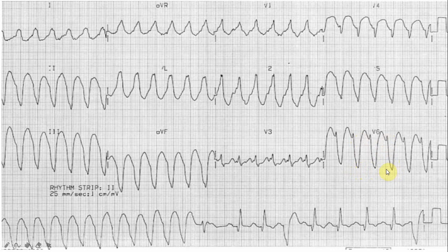In this particular ECG, the distance between the beginning of the R wave and the nadir of the S wave is 4 small squares, which is about 160 milliseconds. Obviously, the Brugada sign is present. Therefore, the second step of the Brugada criteria is fulfilled, which is suggestive of ventricular tachycardia. As the second step is fulfilled, we do not need to go to the next steps.